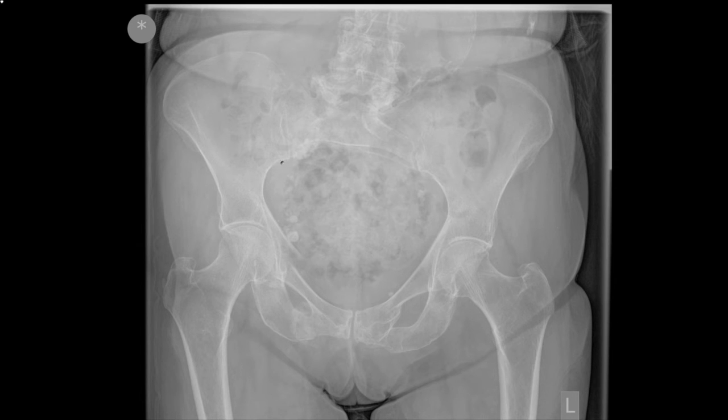If you follow the line down to the cortex of the internal pelvic ring, there is a step at this point before continuing on to the pubic ramus, the pubic symphysis. So we have a fracture through the upper aspect of this pubic bone involving the inferior acetabular portion, and another fracture to the inferior pubic ramus.